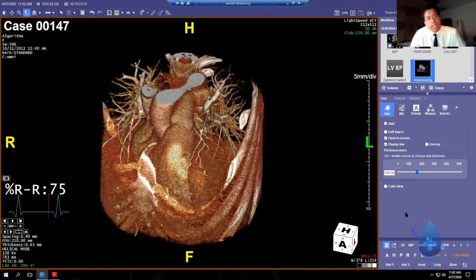I just want to show you the macros, and then these last three vessel viewing algorithms. So these up here are called workflows. These buttons, what we should really call them, are macros. They are basically a preset that incorporates other buttons.